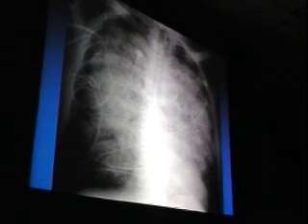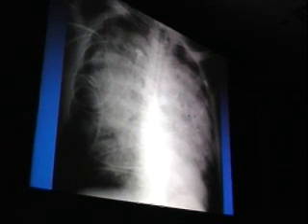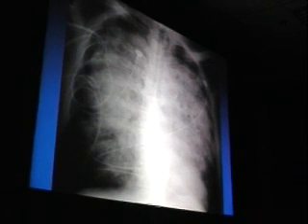Further, in testing situations, I have observed that it is often more difficult for people to come up with a differential diagnosis for airspace disease than just about anything else. And I think that's simply because of our sheer familiarity with films like this. And the fact that we look at this in the ICU, we typically dictate it out as edema, next case. But there are other things that will cause this pattern, and we'd like to at least talk about a few of them.